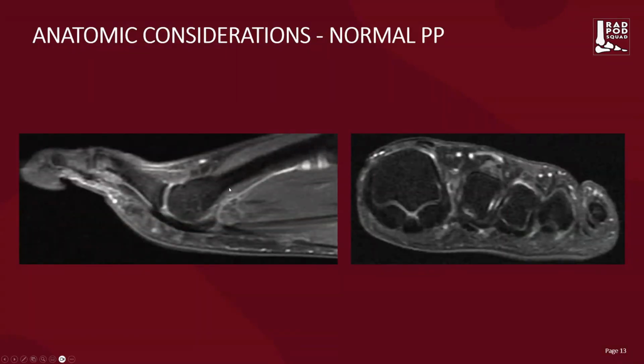Now let's turn to the MRI. So what I've loaded up here are sagittal and transaxial images, and that's really the workhorse of defining plantar plate imaging. So we can see in this sagittal image that you can see the plantar plate itself as this low signal band imperceptibly drawn to the flexor tendon itself. We can see some of the intermediate signal intensity at the level of the cartilage, the hyaline cartilage that divides the metatarsal head and the proximal phalangeal base. Of course, this is cortical bone, which is of lower signal intensity than the marrow element seen here, which is of slightly higher intensity, with a slight amount of physiologic joint fluid seen here.